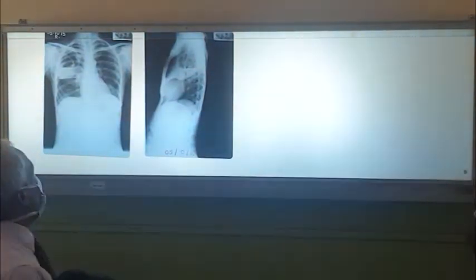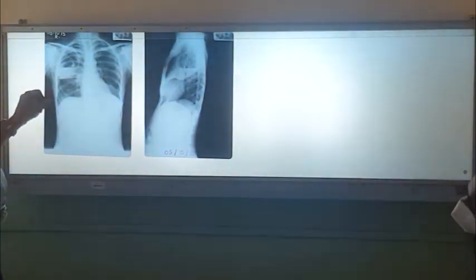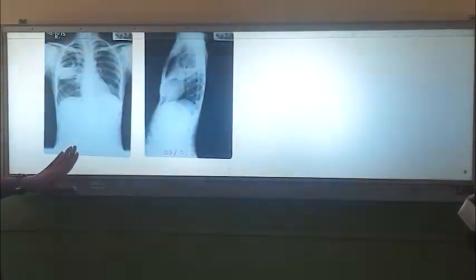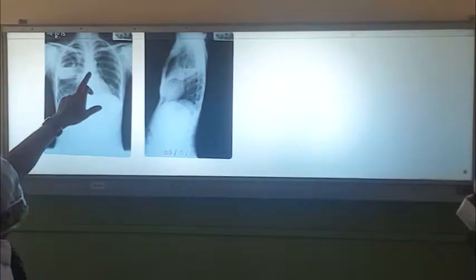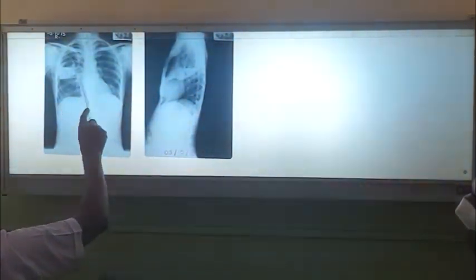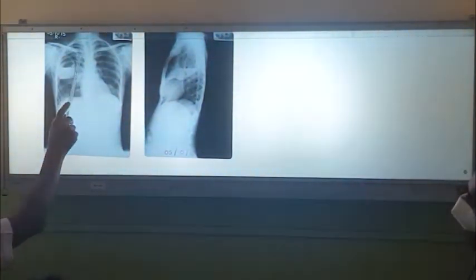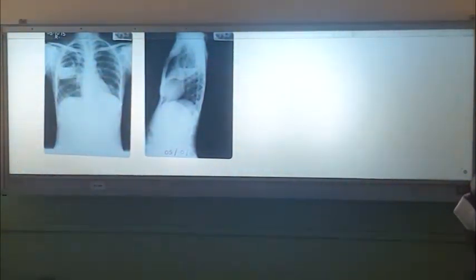So you can see this patient's chest wall. This is a wasted patient, right? Wasted patient. You can see most of the spinous processes and ribs there, right? There is a big cavity, and this must be the transverse fissure. The cavity with a fluid level. A cavity with a fluid level means there's a lung abscess. So it's a lung abscess.